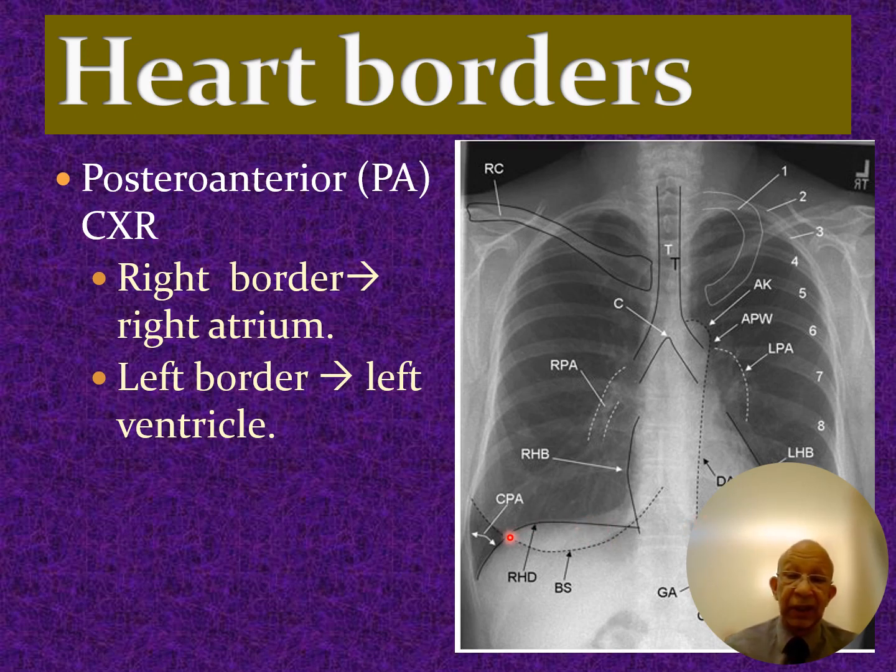Now, you can see the right hemidiaphragm. You can actually go through it, from end to end. It's very clear. This is called the silhouette sign, and it's the interface between the air-filled or gas-filled lungs and the solid organs. And this line is also a silhouette sign. It's crisp and clear. You can trace it from top to bottom. Now, this is the costophrenic angle, and the rule for that is that it should be sharp and deep.